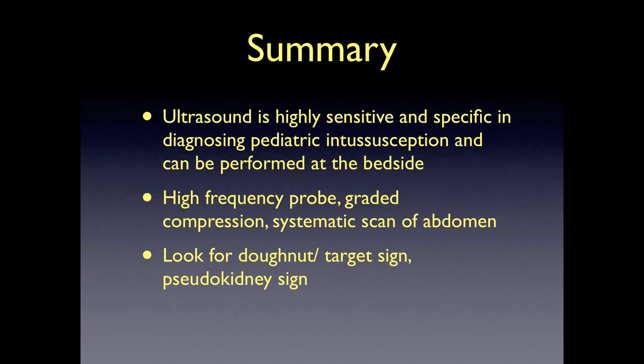In scanning for intussusception, one should look for the donut or target sign, the pseudo-kidney sign, as well as closely stacked layers of bowels in the abdominal cavity in the transverse, oblique, and longitudinal views.